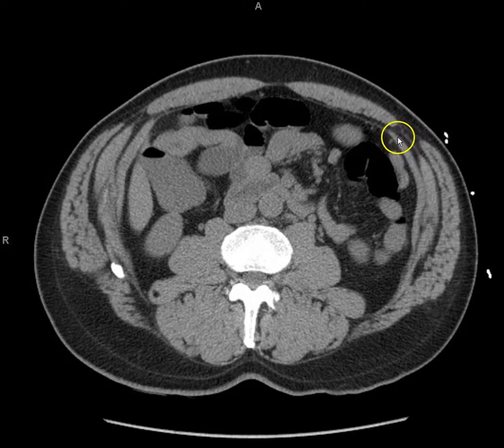Yes. And the posterior layer of the internal oblique. And the anterior layer of the internal oblique and the external oblique form the anterior sheath. So you can actually see the internal oblique split into two pieces that help form the anterior and posterior rectus sheath.